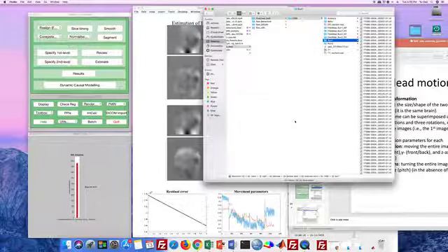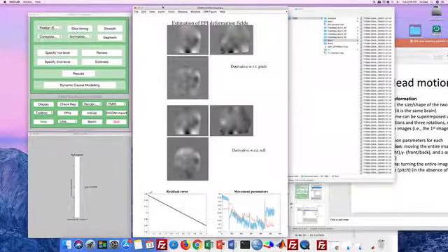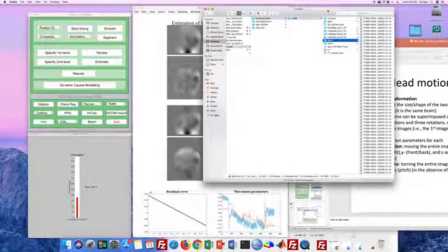Okay, so it will take several minutes to run. Something showed up, but you don't need to care about it. We just wait for several minutes.